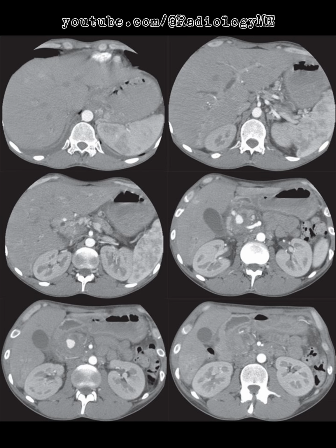Now, when I see something like this, my mind quickly moves to differentials. The enhancement pattern makes me think of a vascular issue, potentially a pseudoaneurysm. If the patient has a history of pancreatitis, that could explain everything quite nicely. A pseudoaneurysm forming within a pseudocyst due to vascular erosion. However, without that history, we'd need to explore other possibilities, such as underlying malignancy, vasculitis, or even previous trauma or surgery leading to an aneurysm.